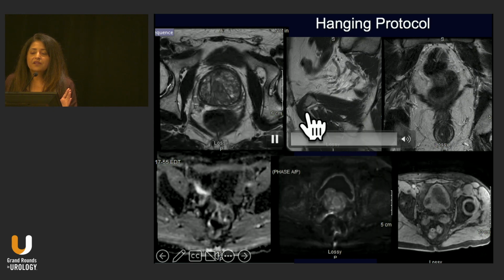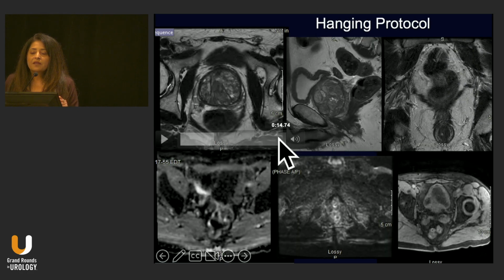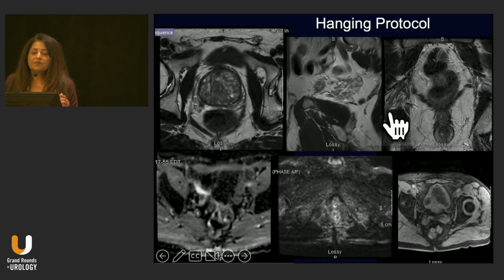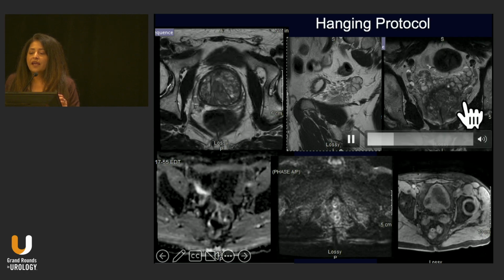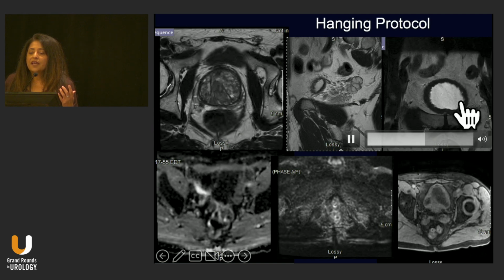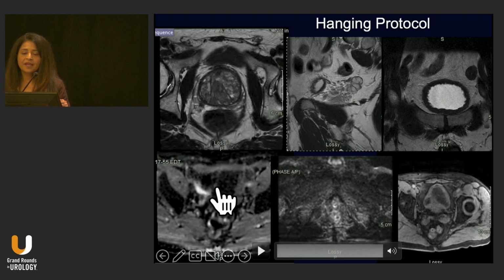And it's not forwarding, but here you'll start seeing this, where there's a BPH, a median lobe hypertrophy extending to the bladder base. You can look at the same thing on the coronal views. And again, the whole idea is to look at it in more than one view because sometimes areas show up better. Here's a median lobe that's going up into the bladder.